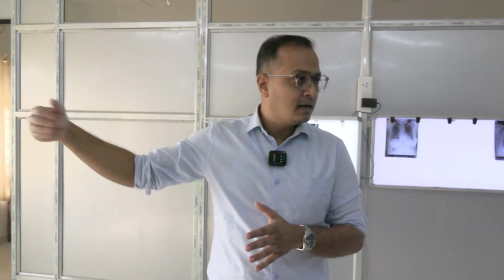Other than these two views, PA view and lateral view, we have an in-between view. We call it oblique view. That means the light source is on the sides, I am standing here and taking a side profile or a 45-degree angle, if it is penetrating my body and taking a profile and taking the picture out here, we call it oblique view. So, there are three views in normal terms that we are seeing here.